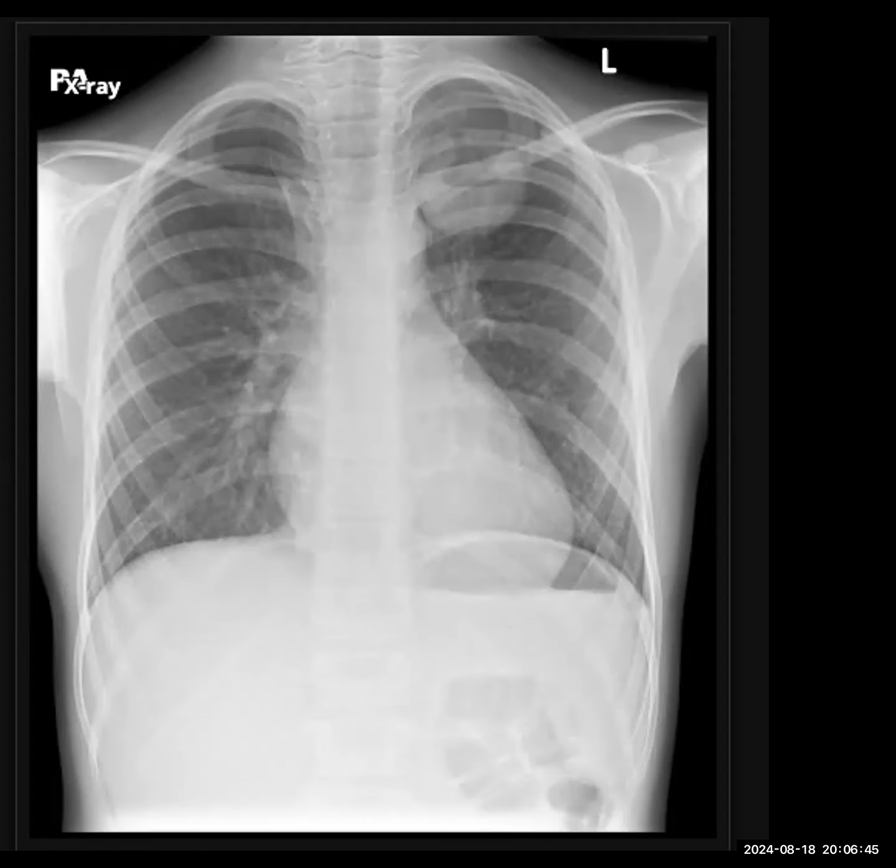I would want to know the history of the patient. If the patient is having any symptoms of fever or raised inflammatory markers, I would think of this in terms of a consolidatory patch within the left apex. Having a closer look at it, I can see there is a lucency within this opacity. So I'm concerned if this could be a cavitatory lesion. There is no overlying rib destruction as such. Now I'm concerned if this could be a consolidatory mass with cavity.